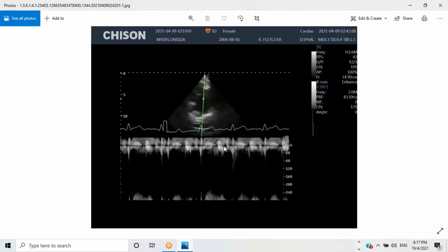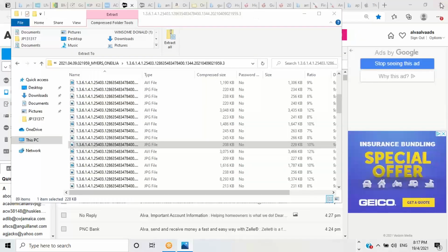What we're going to do, we're going to go over a number of studies so you get an idea what tricuspid regurgitation, mitral regurgitation, aortic insufficiency, pulmonic insufficiency looks like. So this is a little envelope. You probably don't recognize this little envelope, and it's a systolic flow from the onset of the QRS to the end of the T wave, but because it's not significant, you don't get a complete envelope.